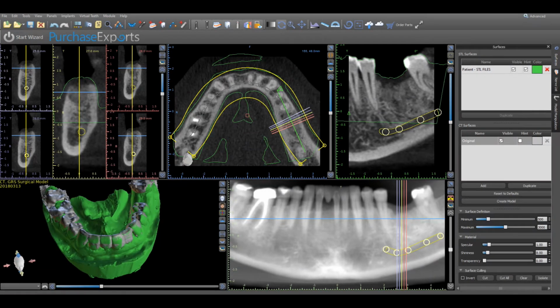And finally, the integrity of the edentulous site needs to be verified prior to placing the virtual implant. To do this, go to the upper middle of the screen, click on the density icon, and return to the cross-section window in the upper left and left-click on multiple areas of each sub-window to verify the density of the bone as per the CT scan. Keep in mind that this measurement is strictly reliant upon the CT scan and may be clinically different under surgical conditions.